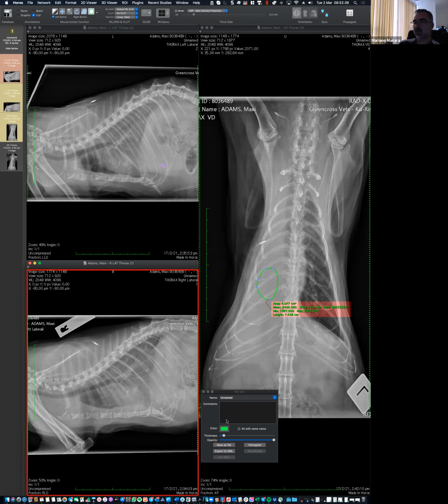So we can try to see if it's more pleural or more lung. I promise we'll do that. The other thing that I want to mention is, let's say, and let's go as far as saying there is increased opacity within that left hemithorax. And let's assume that I don't want to speculate anymore, if it's in the pleural space or if it's in the lung. What to do next to learn more? And the answer is ultrasound.